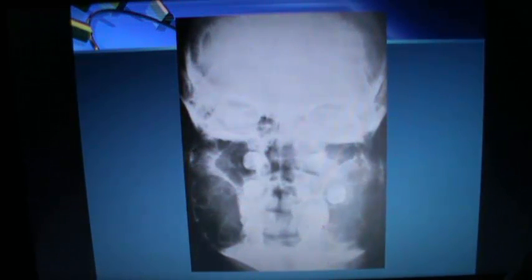Mandible involved in fibrous dysplasia is cherubism. This pelvis is showing a lot of focal foci of lucencies in a young patient, denoting that we are dealing with fibrous dysplasia. On the other hand, if you find these changes in an old patient, please consider deposits.